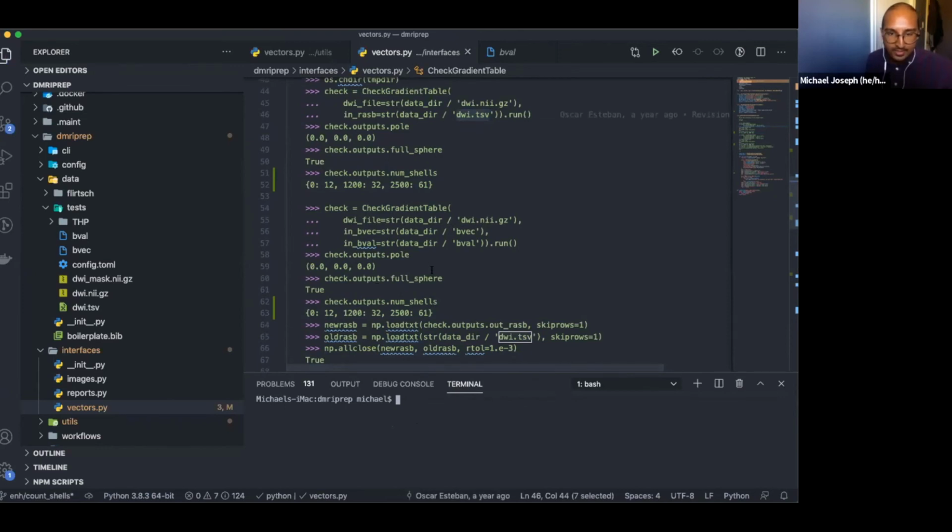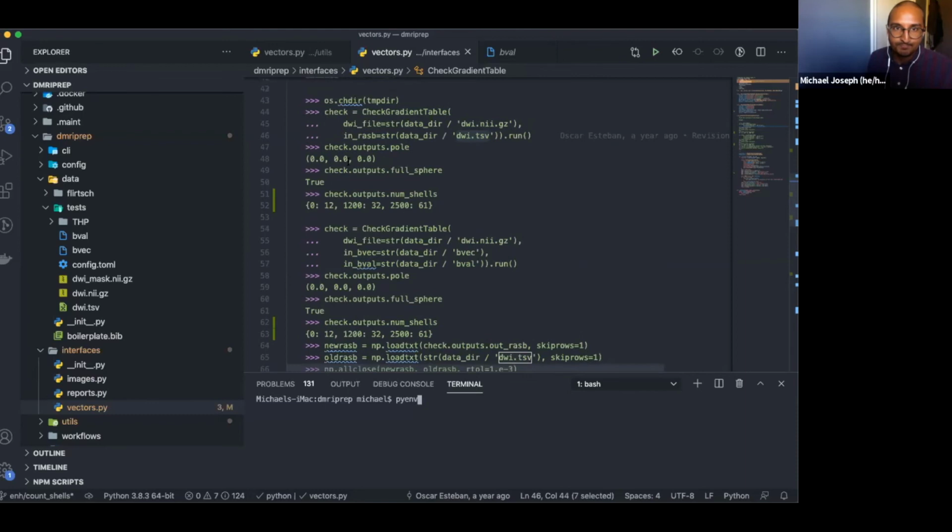There's two things that I want to check. One thing that I want to check is the code format. Python has this thing called PEP8. It's a series of guidelines on how you should format your code and make sure everything is formatted correctly. So I'm just going to import my Python in virtual environment.